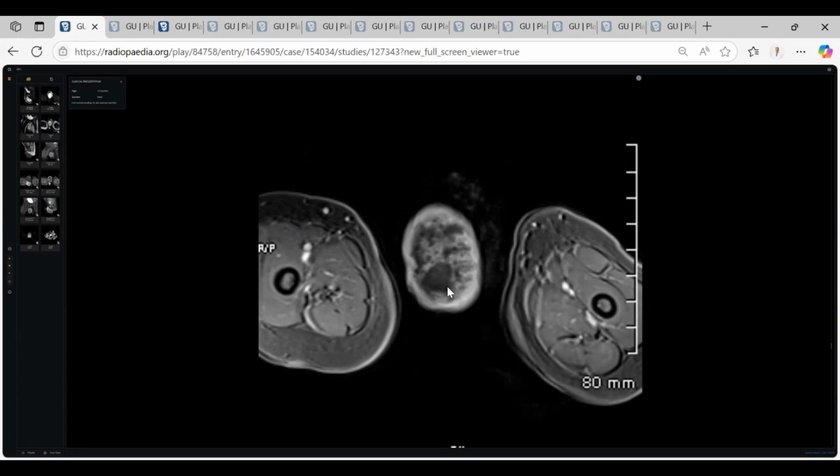As the patient has a raised hormone level, this is likely a germ cell tumor. There are different variants of this, like a yolk sac tumor, endodermal sinus tumor. So I'm not exactly sure about what it could be. Could this be a seminoma? Seminoma not, as it is not as well defined and there are heterogeneous areas within it. So less likely.